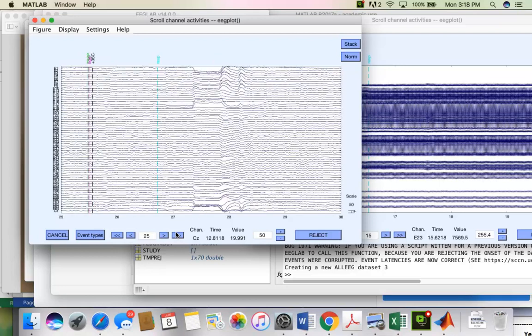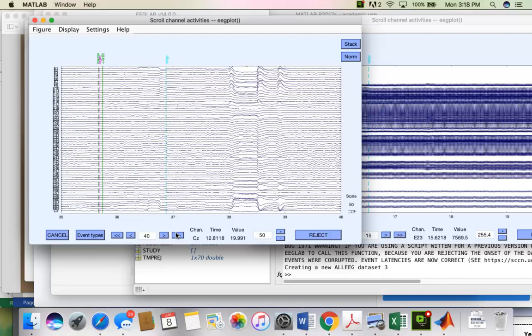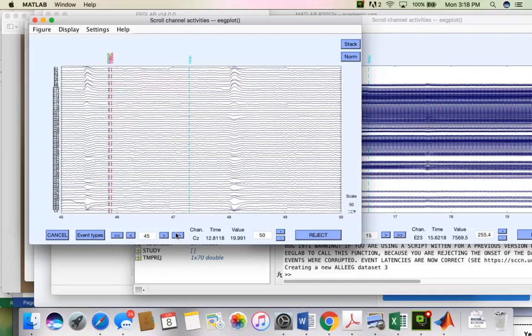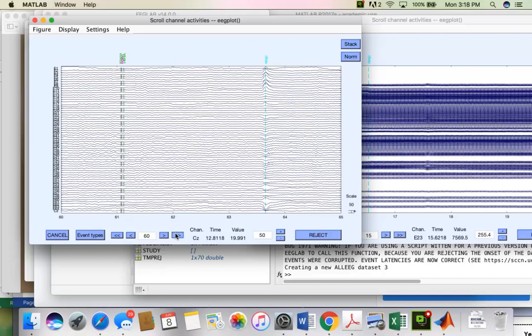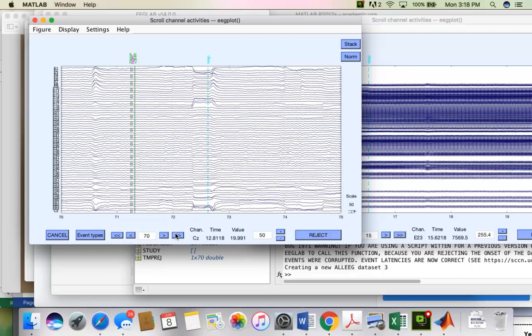The goal of coming in and selecting the really bad areas, and there are ways to automate this, even within EEGLAB, but it is important to me that you go through this by hand, because as you go through by hand, it'll make it easier for you to begin to get a feeling for what these data look like.